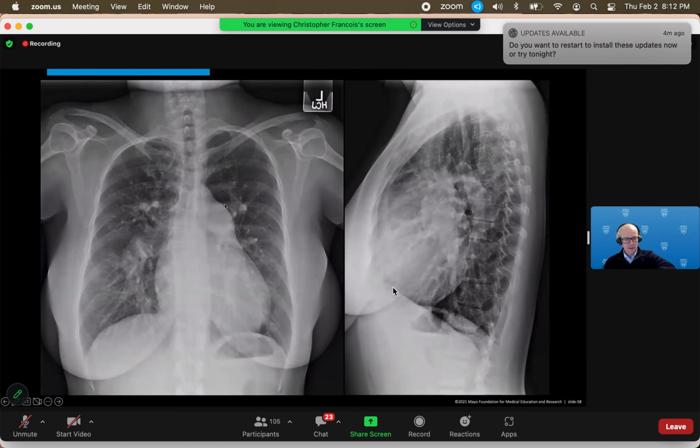And I think in the interest of time, I'm going to go through these cases rapidly now so we see some other types of pathology. This is a chest X-ray showing massive pulmonary arteries. The right pulmonary artery and the left pulmonary artery are much larger than the aortic arch. The central pulmonary vessels are also dilated. This is a patient who has pulmonary hypertension.